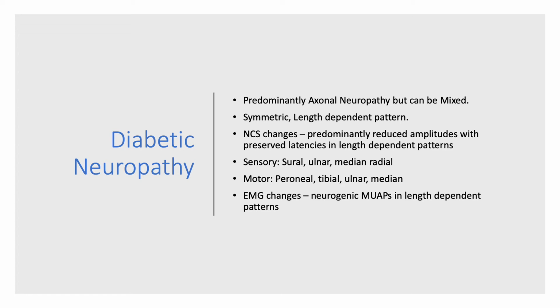As we know, the nerve conduction changes would show a predominantly axonal pattern, which will be reduced amplitude with preserved latency and in a length-dependent pattern. And the length-dependent pattern is a very important key to diagnosing these neuropathies.